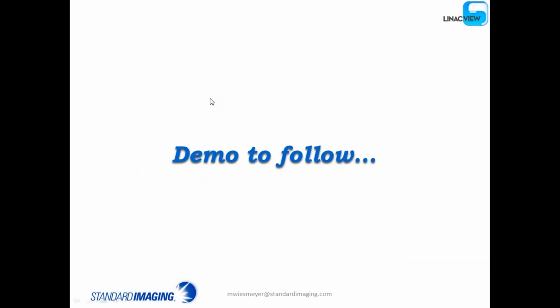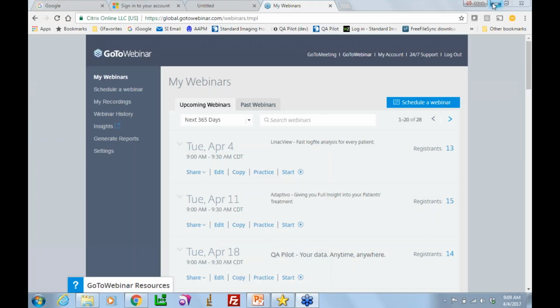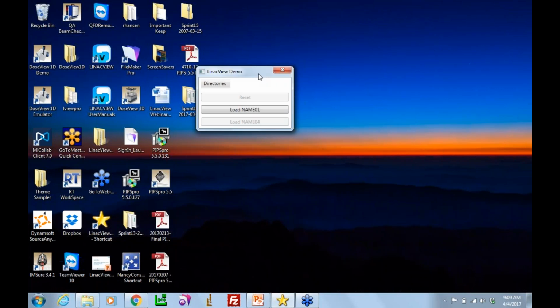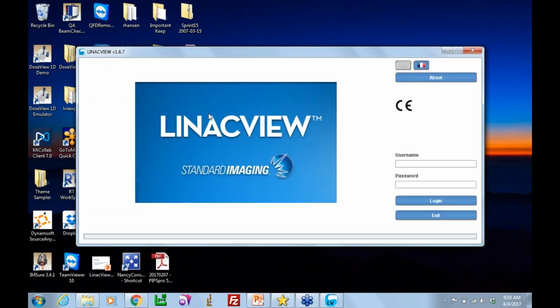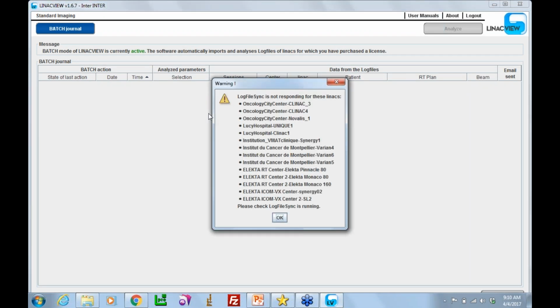Okay, here's the demo I had mentioned, and what I'm going to do is start up LinacView. Here we go. So first I'm going to log in as if I were a therapist. And as a therapist, there are a lot of things about the analysis that the therapist might not be especially interested in.